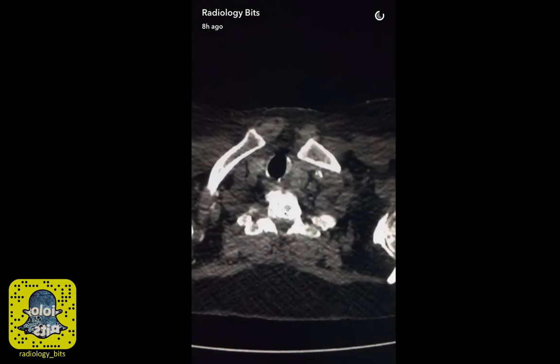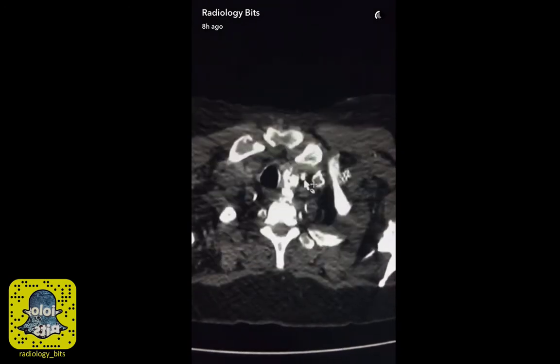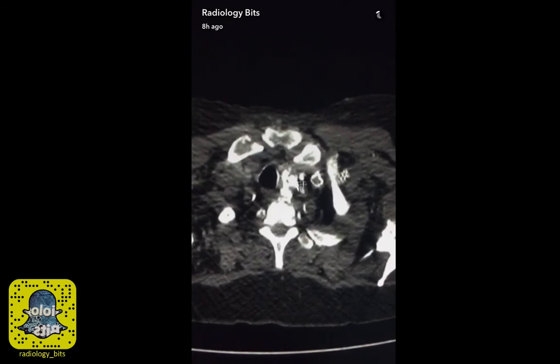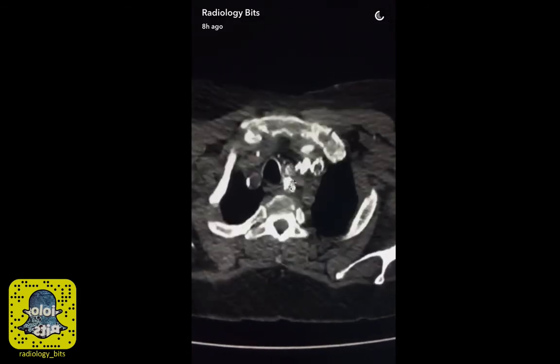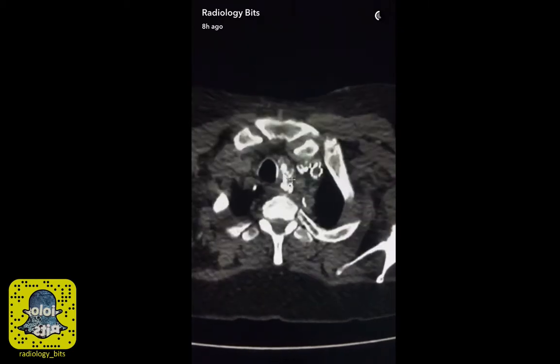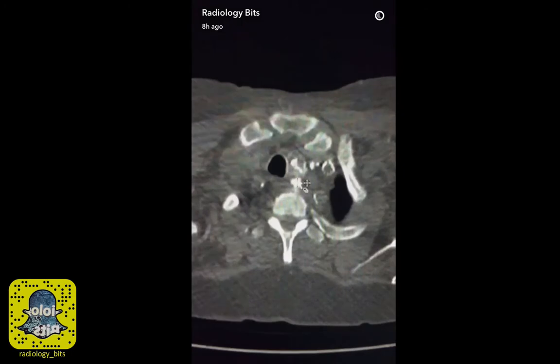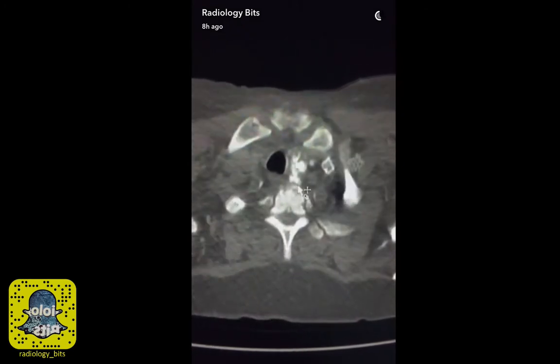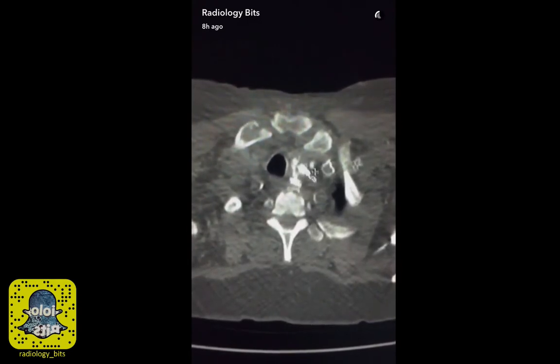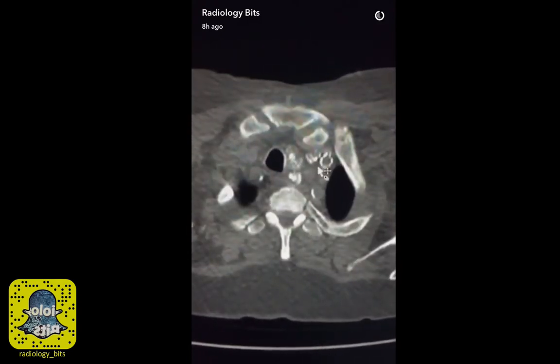Now back to the quiz case, and let's take it one by one. First, this is the thyroid gland and has these heterogeneous calcific densities. So these calcifications are partially or completely calcified thyroid gland nodules. Here I changed to a bone window, which shows calcifications in a better way. Now that we know that these are thyroid related, let's forget about them. And let's look at those here.